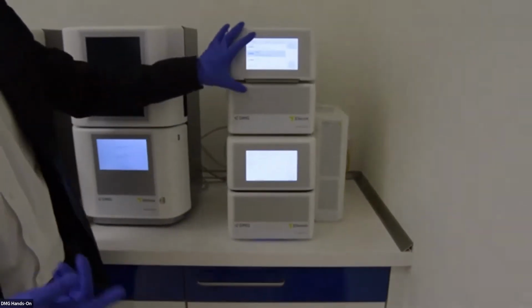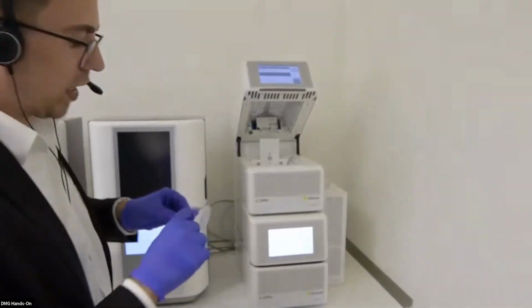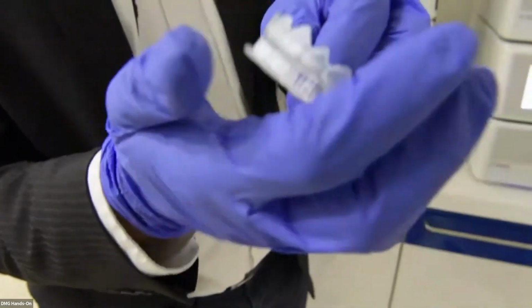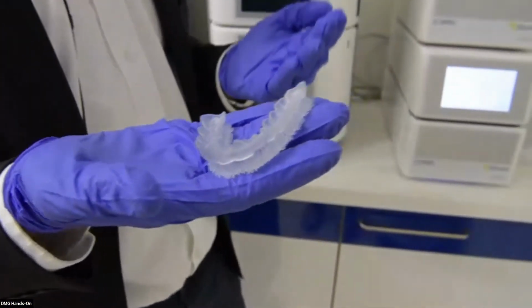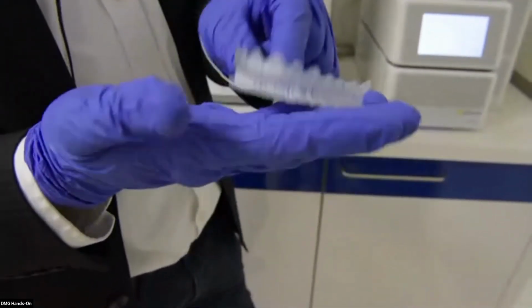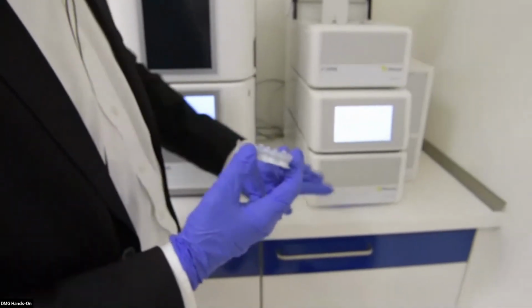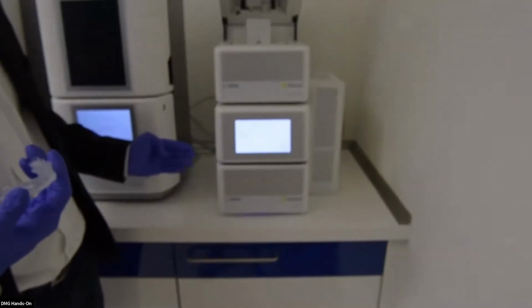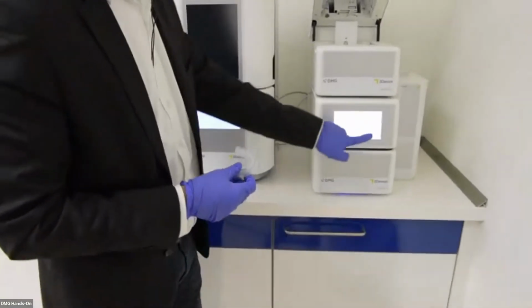When we are finished with the cleaning, we go inside our 3D cure. So I already have here a clean splint, but it's not post-cured. So it won't have the right mechanical properties, because during the printing process the layers only stick to each other, but in the post-curing, it gets its final mechanical properties. I will stop this device now because of the noise, but I think you can imagine how it will go on. The whole process would take approximately 6 to 8 minutes.